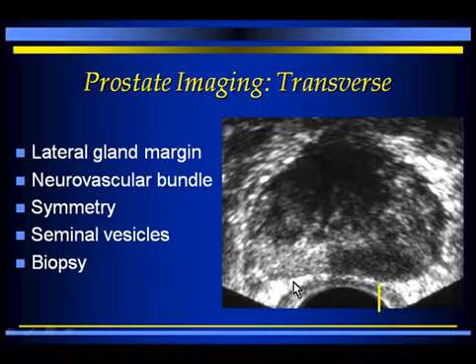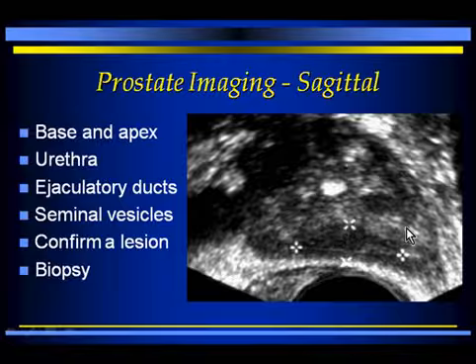And we often use the transverse imaging plane as the plane preferred for biopsy because you can actually tell how far out you are laterally. And it turns out that prostate biopsies should probably be done in a very lateral orientation.